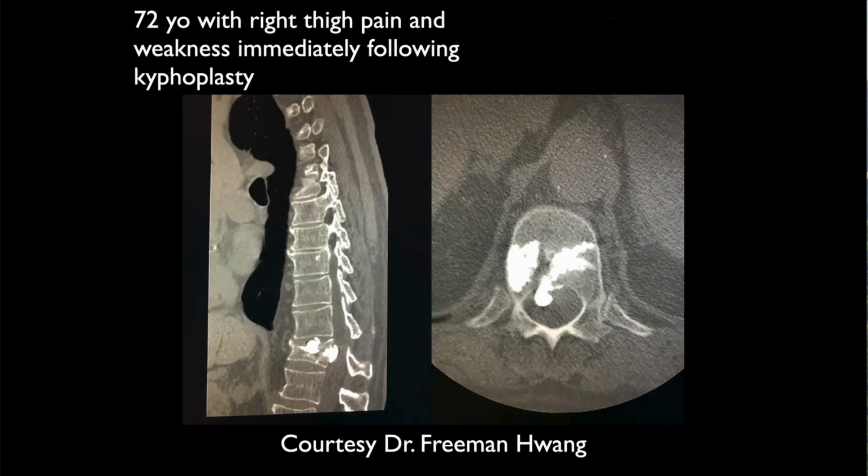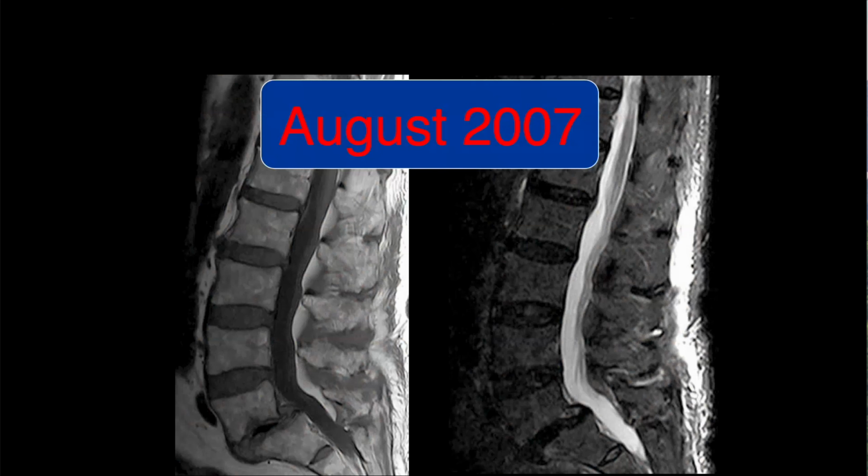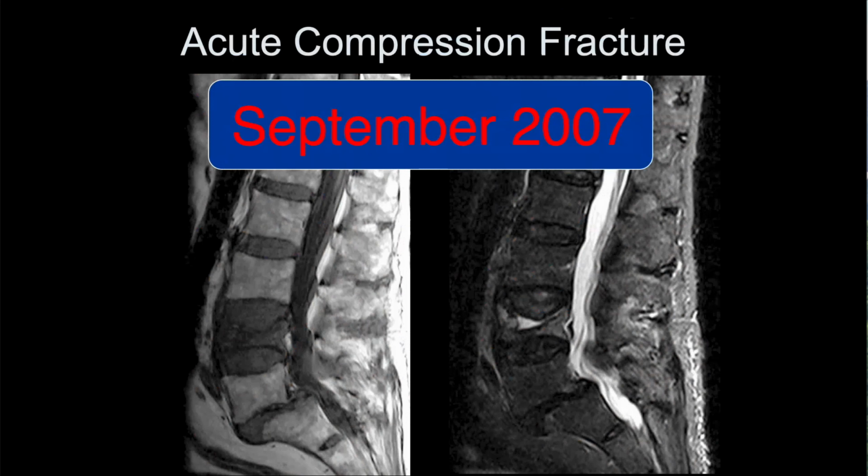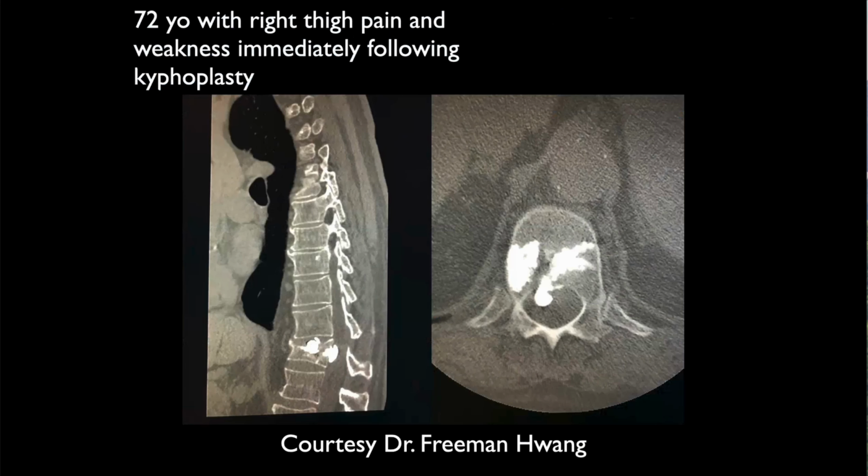It still doesn't bulge posteriorly, does it? No, it's not bulging. It decreased height, but it's actually not bulging. With all that compression, you would think it would do that, but it doesn't. But this is typical of osteoporotic type compression fractures, as opposed to tumors. The posterior longitudinal ligament is pretty strong. I don't know if we'll get around to tumors of the spine this year or not.